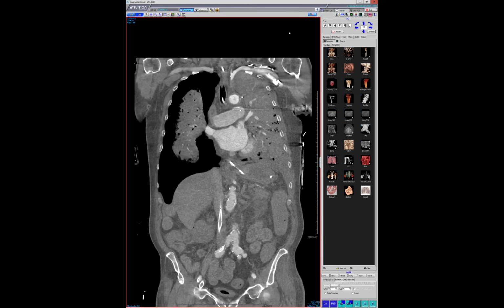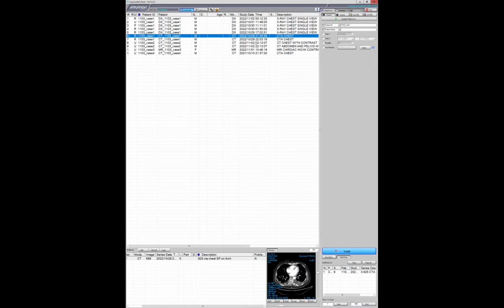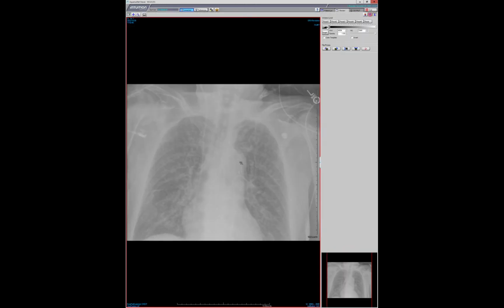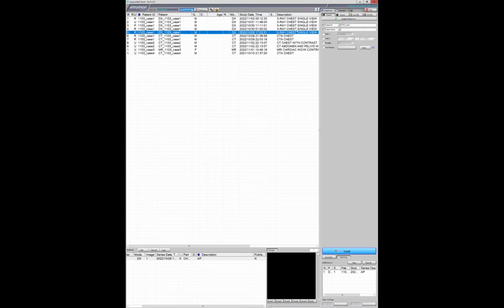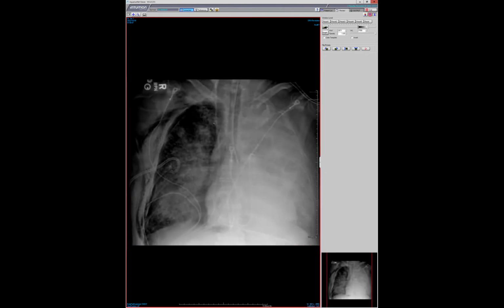Yeah, this was at ECMO. But he was on ECMO, I think, was he on ECMO for the prior CT? No, but the chest X-ray that had him here, he's also on ECMO at this point in time. So yeah, it did occur with ECMO, and I agree that a lot of it is just the lungs not being used. I was just shocked at how quickly they cleared.